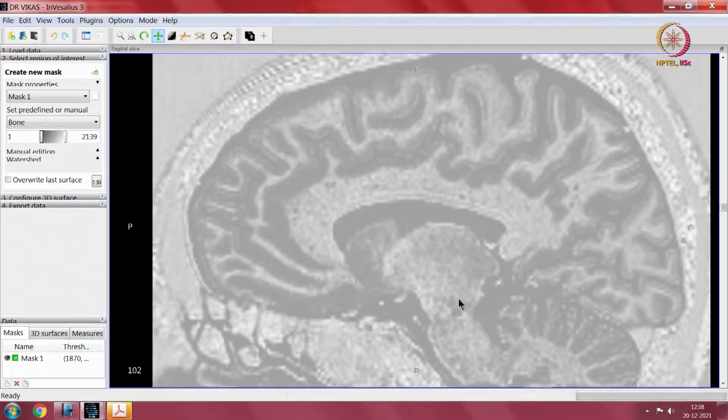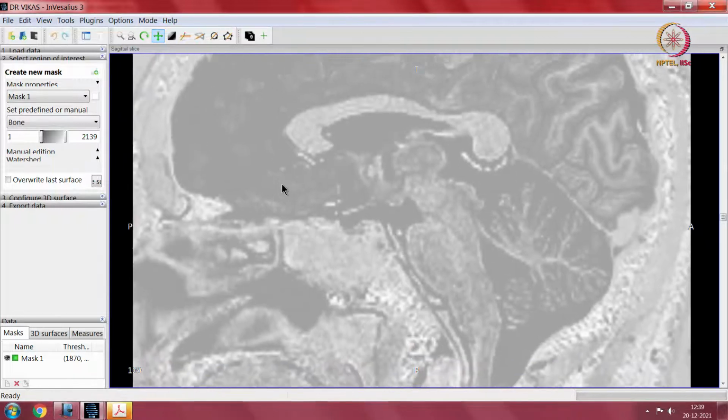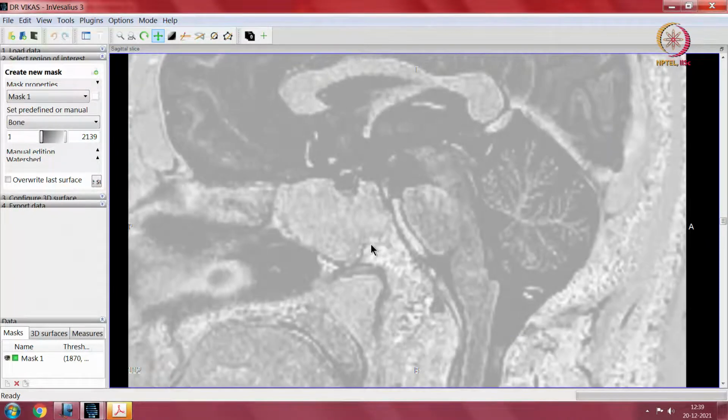here, brainstem here. So, this is the midbrain. You can see the midbrain which is continuing almost with the thalamus. Just below the midbrain is the pons, which you can again see as a bulge, a distinct bulge which is separate from the midbrain. So, following the pons down, there is another bulge over here. So, this is the pyramid of the medulla, and the pons ends here. This part is the floor of the fourth ventricle.